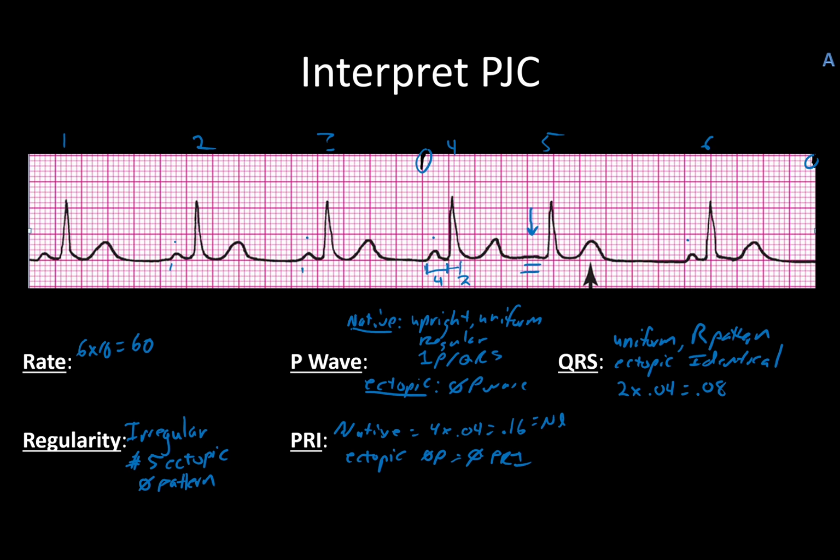Now you may ask me the question, why did you go with this location here as the end of your QRS and not way down here? Well, because there's some sloping involved, it really does make it a bit more challenging to decide when your QRS ends and when your ST segment begins. Fortunately with this one, it's really only a matter of about a block or so, so it really doesn't create a bundle branch pattern per se.